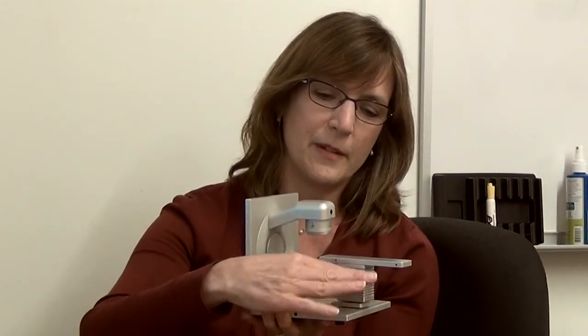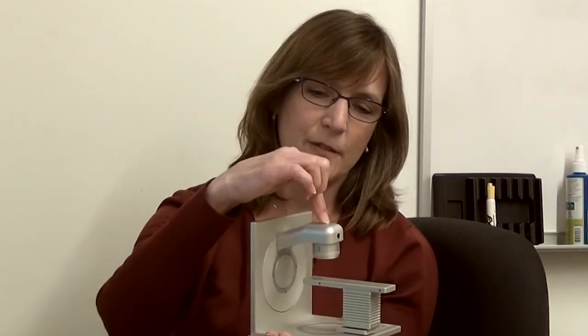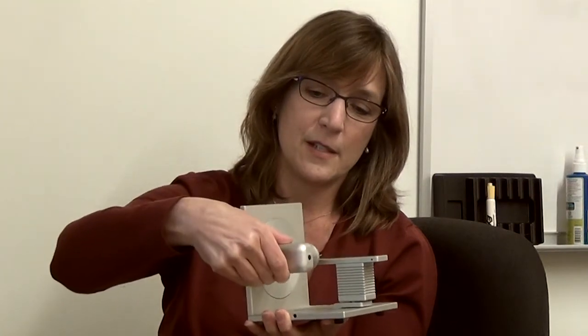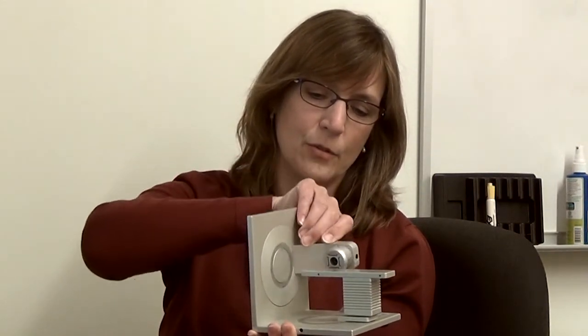Miniature radiation linear accelerator. Our patient would be on this table. The table would actually be lower and then would raise up. It would slide in, and we would align the area that we're treating under the gantry. This is the gantry, and the radiation beam would be coming from here. So this machine can actually rotate 360 degrees and deliver its radiation to the tumor at the same time.